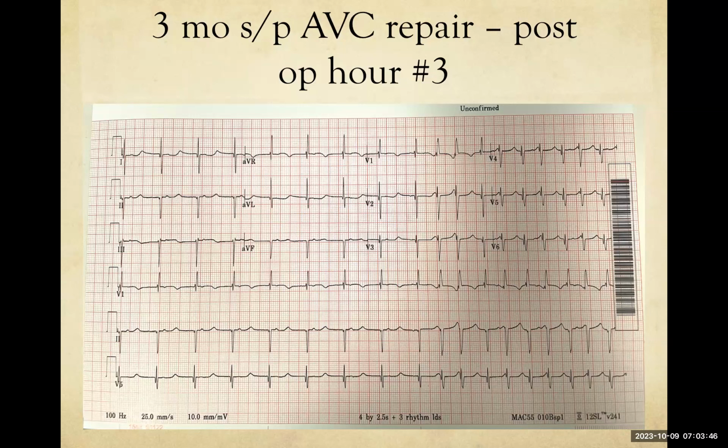Because then when I go to the next QRS, I'm not seeing anything before that. Yep. And then as you continue on, towards about 2/3 of the way through the screen, you kind of see that continued trend.